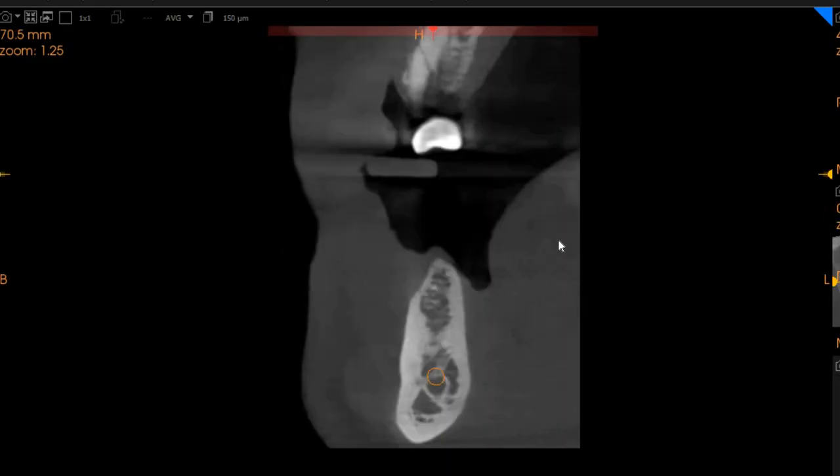Now moving to the lower right 5, this is the lower right 5. Here we've got D2 quality bone. We've got a thin ridge at the tip of the crest, but if we move approximately 4 millimeters below, we've got a ridge width of approximately 5.8 millimeters and a length of 13 millimeters. And you can even go deeper. This area has D2 quality bone.